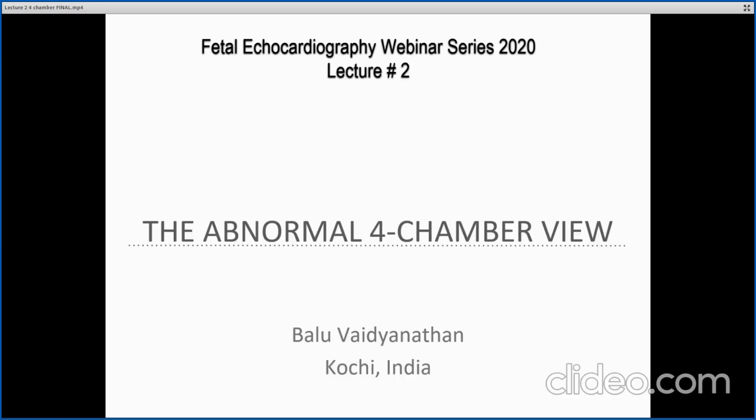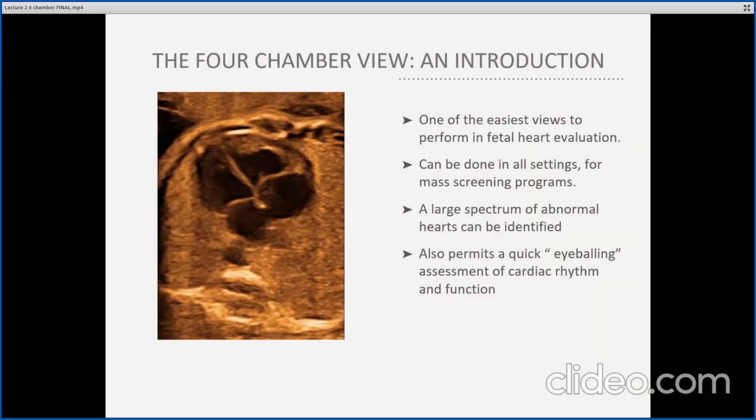Good evening. I'm Dr. Balu Vaidyanathan from India. Welcome back to this fetal echocardiography webinar series organized by Voluson GE Asian segment. This is the second lecture of the series, and in this lecture we shall talk about the abnormalities of the 4-chamber view. The 4-chamber view is one of the easiest views to perform in fetal heart evaluation.